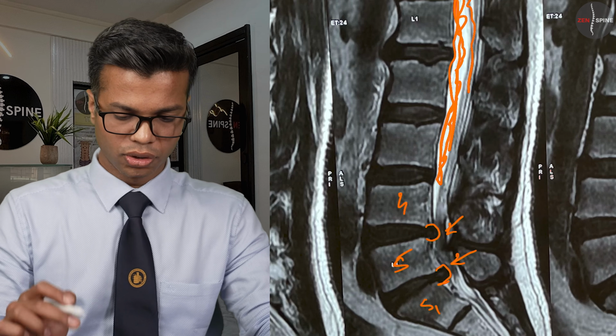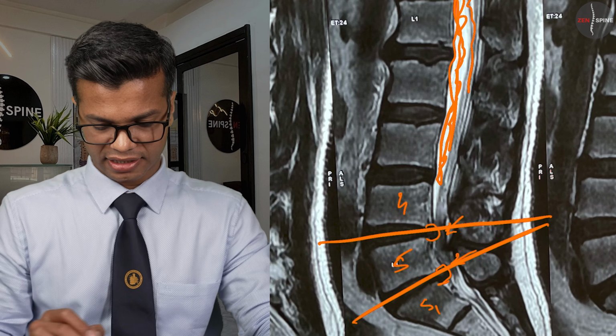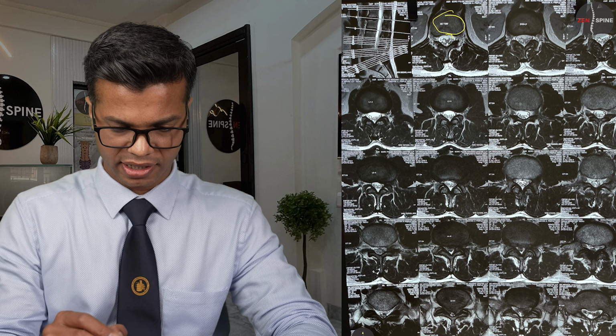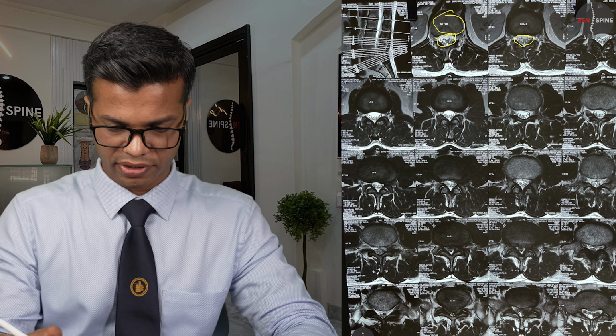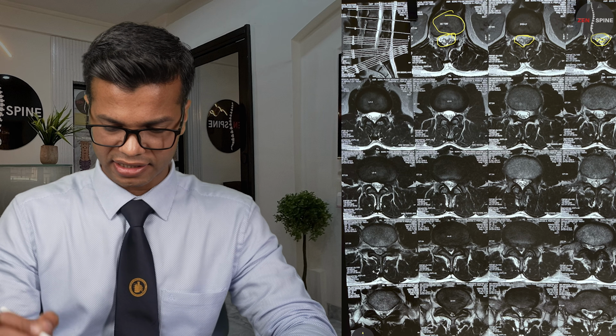These are the 2 discs which are bulging and protruding into the spinal canal, occluding the white fluid and pressing on these nerves. To look into it in more detail, they take axial sections or slices at these 2 levels, and that slice looks something like this. Now, this is an axial picture where you are looking at the vertebral body, and behind the vertebral body is the thecal sac, where the cerebrospinal fluid, or the white fluid, is enclosed. In this white fluid are the black dots, which are the nerves floating inside the fluid.